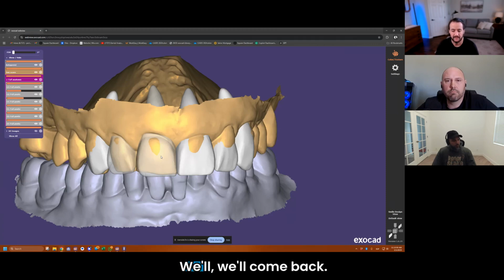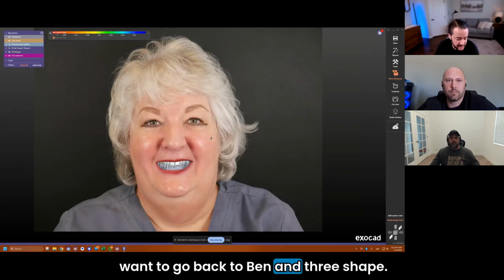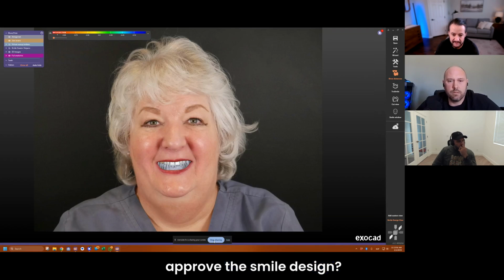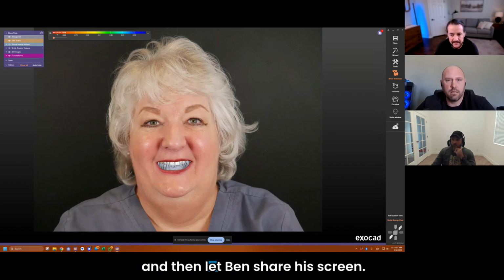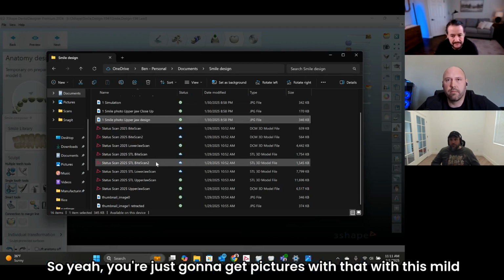Okay. We'll come back. We'll wrap up with the 3D model in Exocad, but I want to go back to Ben in 3Shape. Ben, what's the payload from 2D smile design? Like, what are you delivering to the doctor for him to view and approve the smile design? Yeah, so it's literally this. Dan, if you want to stop sharing and then let Ben share his screen. Oh, yep. Right, so yeah, you're just going to get pictures with the smile design.